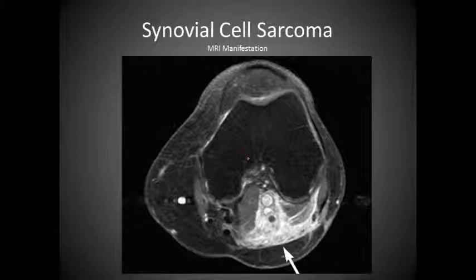Okay, this is what it looks like in terms of MRI. You can see this area here. And notice the appearance that it has.